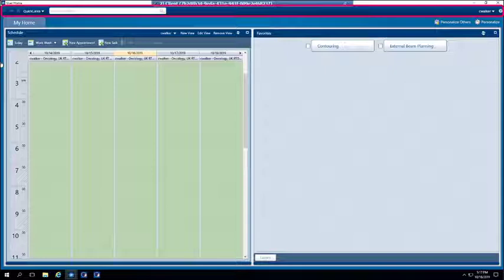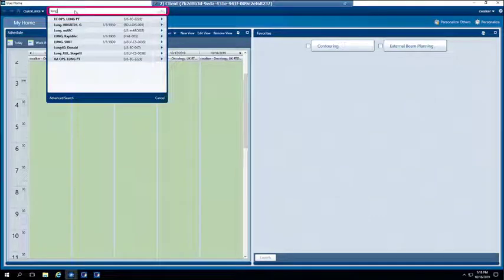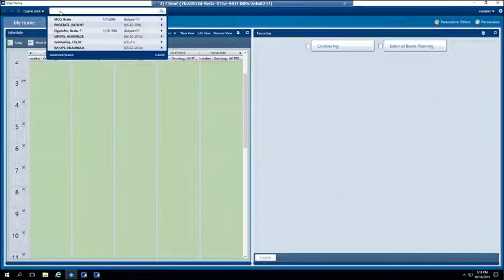Enhancements have been made to the Assistant bar for faster, more efficient navigation throughout the system. When searching for a patient in the Patient Search bar, a patient search can be done by name or ID. The system remembers the last 6 patients for reselection.